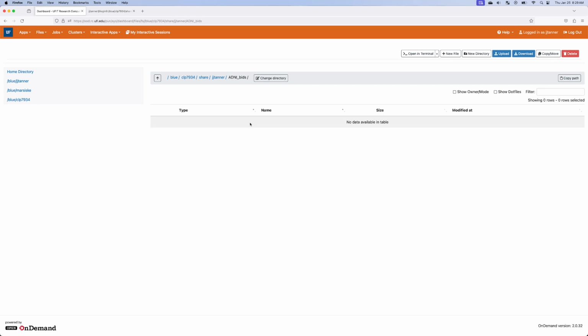Technically a BIDS directory structure is going to have more things in it. There's going to be some other files that talk about the participants and other cases. We're not going to worry about that right now. But within here, we're going to want a full directory for each participant, and then we're going to have some subdirectories.